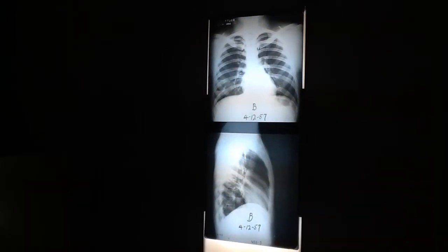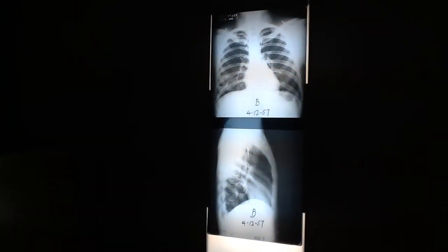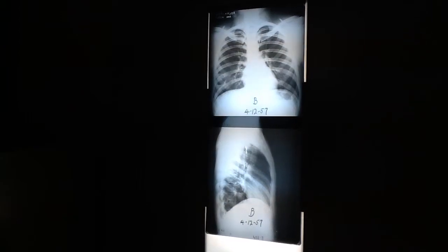Yeah, it's basal, but give me a segment. 8 or 9. Maybe a little high. 8, 9, or 4. Okay, so on the frontal, 4, 8, or 9. Just looking at the frontal. When we go to the lateral view, which one can we eliminate? 9. 4.